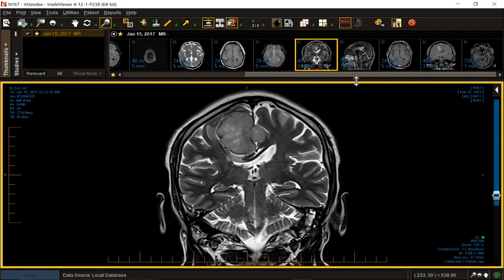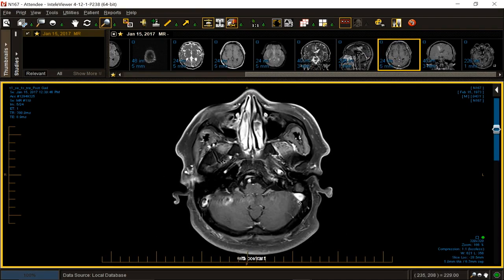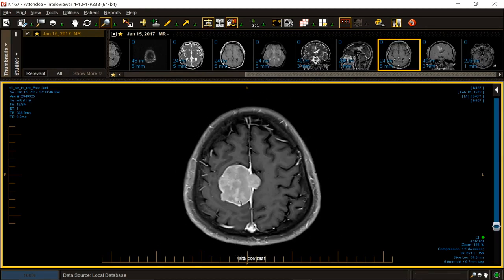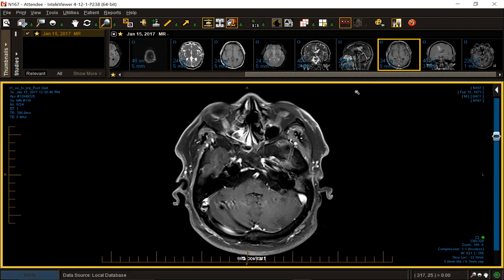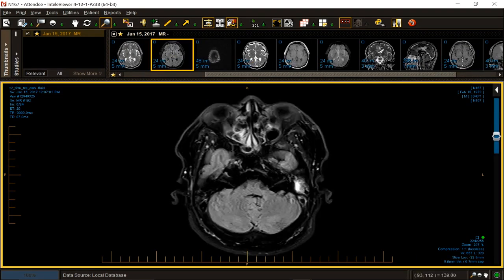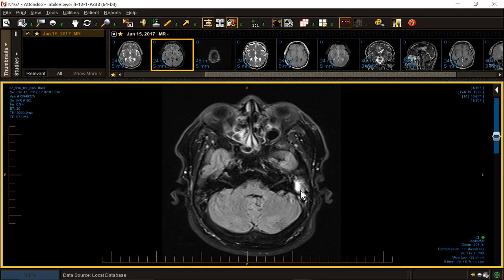Easy unknown, blind case, should be a 30-second diagnosis. While you're doing that, I'll point out the pulsation artifact commonly seen between the lateral and sigmoid sinuses. That is not real. You can just gaze up for a moment while you're studying. There is ethmoid sinus disease for those of you that haven't taken your medication today. Just kidding. There is a very confluent area of signal alteration, which I would refer to as otomastoid air cell inflammation. Consider CT for further evaluation or assessment with audiometric testing.